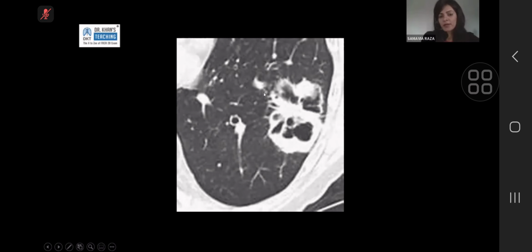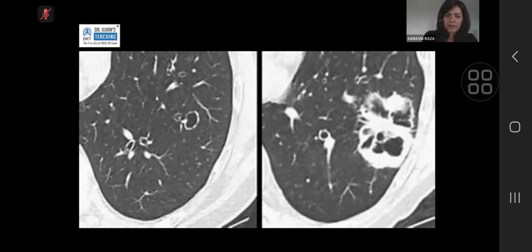So you would say this is a part cystic, part solid lesion in the left lung. You would measure it. So probably about bigger than 2.5 centimeter, and you would escalate it to the lung cancer MDT and urgent respiratory referral.